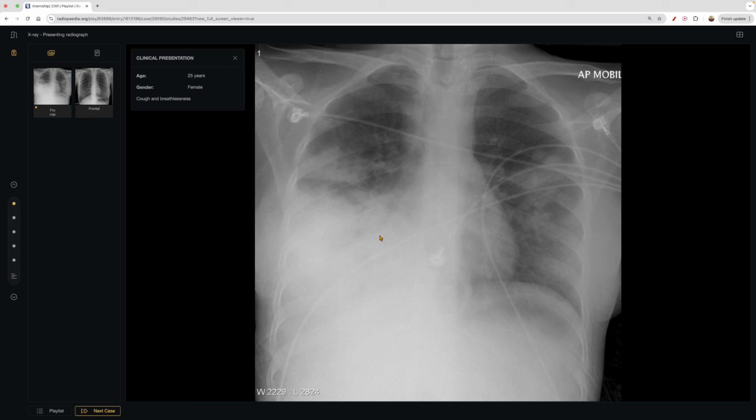So now this is another case of pneumonia. It's a right lower lobe pneumonia because we're not seeing that diaphragm. This is exactly what I was talking about. You don't see that diaphragm. You don't really see that right heart border anymore either. So it could be a right middle lobe pneumonia as well, and there's maybe some consideration of right upper lobe pneumonia. So this is pretty diffuse. And you see how it's all together. That's very classic of pneumonia.